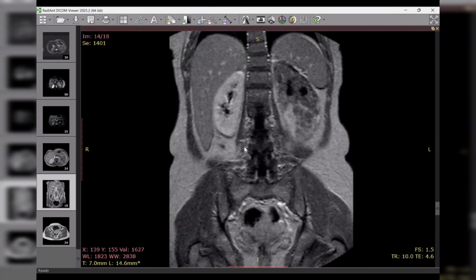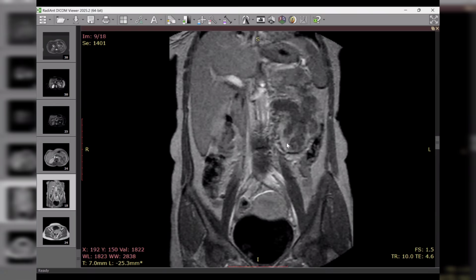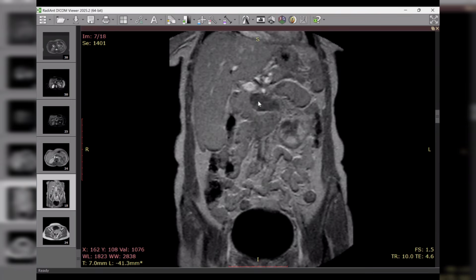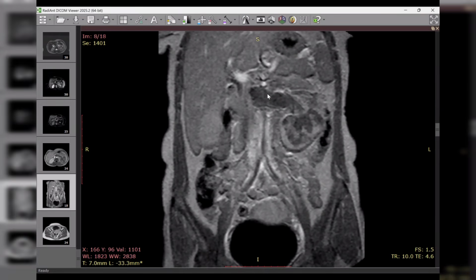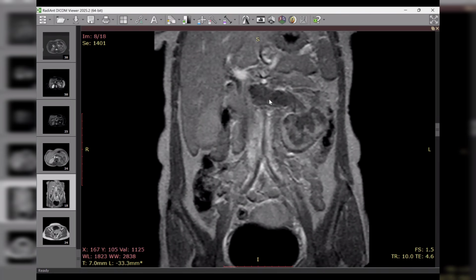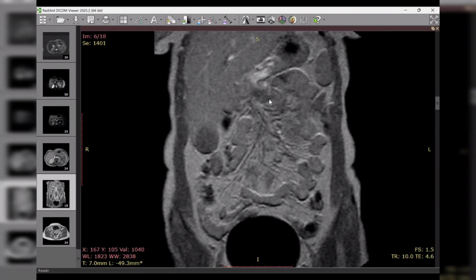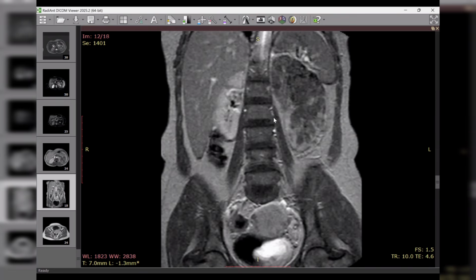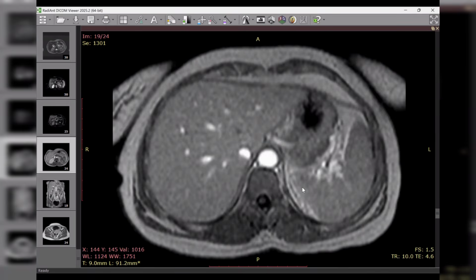Okay, let me discuss this case with you. If I consider this as a neoplastic process with infiltration and extension into the left renal vein, would there be any enhancement of the vein if it is a malignant thrombus? Yeah, there must be enhancement. Okay, but there is no enhancement, and we confirm it here. Look, this is the post-contrast, by the way.